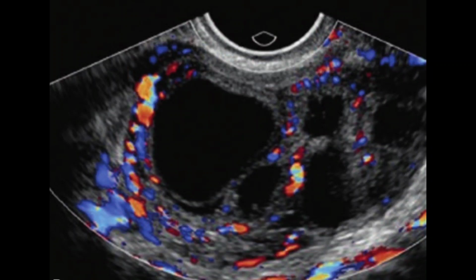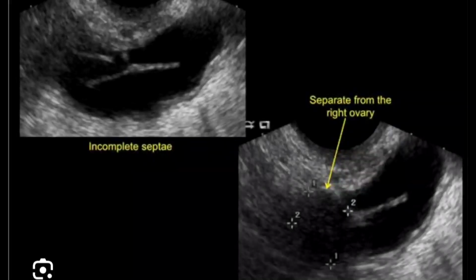Further workup is recommended to rule out the exact cause and nature of cause. On the ultrasound imaging, particularly on transvaginal scan, there are specific signs, specific features for the ovarian abnormalities and for the dilatations of the fallopian tube, and to pick the pelvic inflammatory disease.